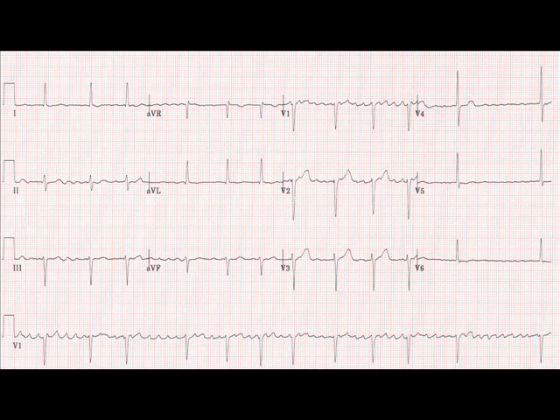Is it a clean trace? Certainly is. The lines are nice and sharp and clear, and they progress horizontally across the paper. Check your calibration, and although absent here because it's a textbook example, you must see 25 mm per second printed on the recording, normally on the bottom left. You must also see the box calibration, and it must equate to 2 large squares high, and it certainly does here. The next important question is: is the patient in sinus rhythm?